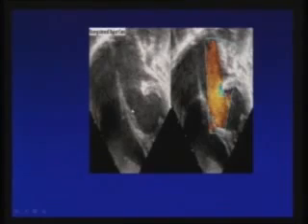I know it is left atria, it is right atria, and here you will look at the offsetting. Look at the offsetting. This valve is more apically placed. It has attachment to the ventricular septum. This is very smooth, this is comparatively rough. So the information from this 4-chamber view you are getting is the AV discordance. Outflow we have to define, whether it is VA discordance also, leading to corrected transposition.